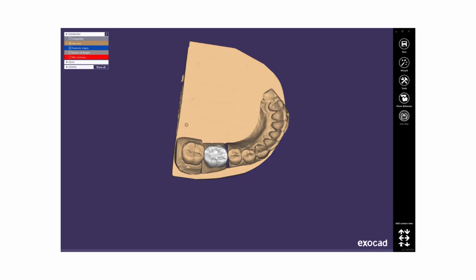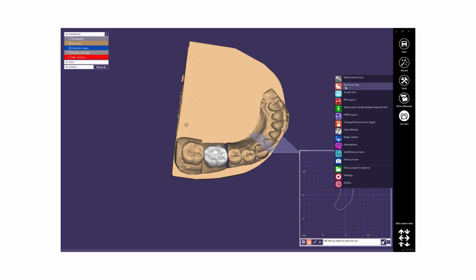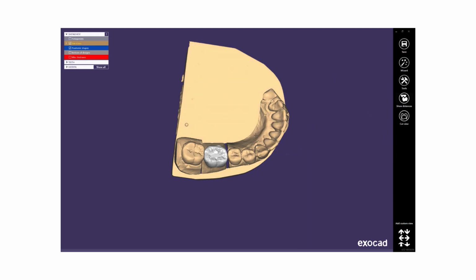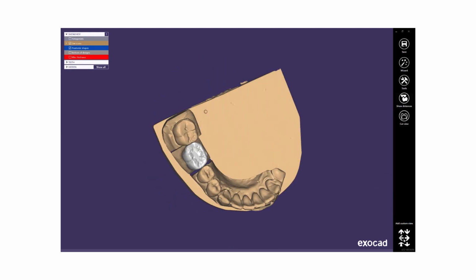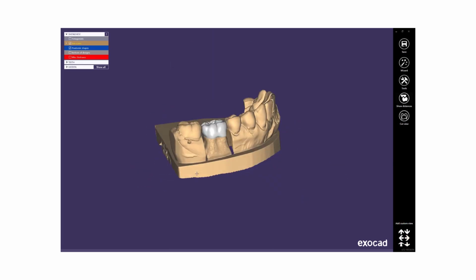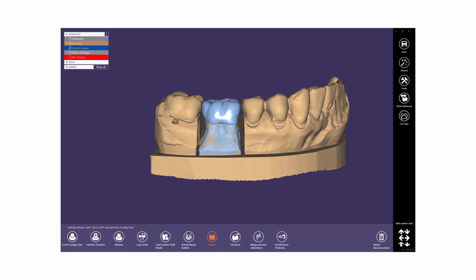So then I have cut view, which is basically a filter. We have a similar option right here, which is the sectional view. It's kind of similar, it's doing basically the same thing, so nothing really exciting. And well, here then we have different types of views, right? If we click on this arrow, then if I'm gonna click on this object, as you can see, if I click on my crown, down here I have different types of options, right?